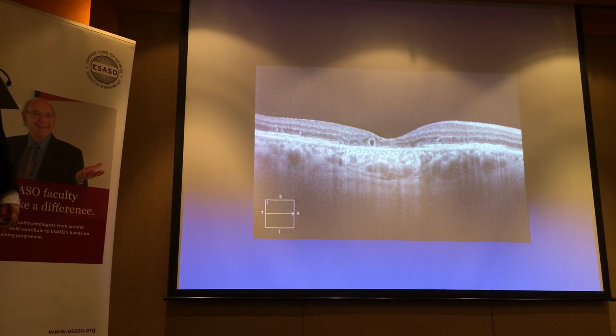Outer retinal tubulation. Good. So you can see, and how do you tell? Because there's this hyper-reflective edge around it, whereas a typical cyst doesn't have that. Yes, it's been mistaken for cyst, and if you're just chasing after this, you could be injecting and injecting, and it's not going to go away. Okay.